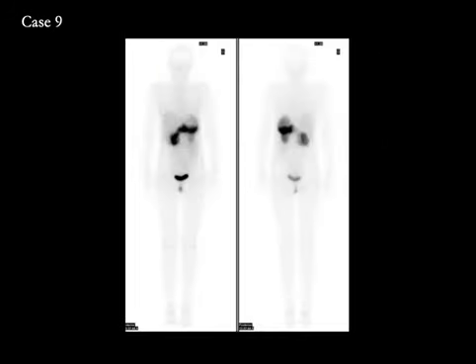Case number 9. This is a rare example of a diffuse pancreatic neuroendocrine tumor. You can see here on the anterior image, the entire pancreas is enlarged and shows diffuse increased uptake of indium-111 octreotide. On the posterior image, there is attenuation artifact from the spine, and that is why the activity is not seen in this region in the midline, but we see that the rest of the pancreas that is visualized posteriorly is swollen and shows intense uptake from a rare diffuse pancreatic neuroendocrine tumor.